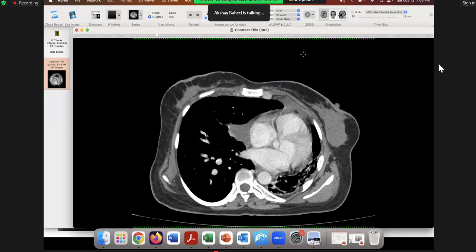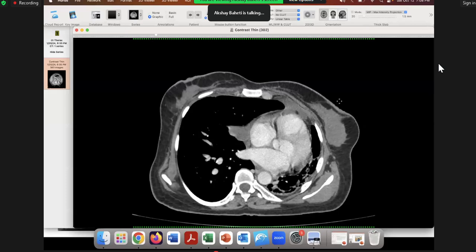So this one is a little tough. I mean, in the sense it's not, so every Tata person will catch it because we are so used to seeing breast cancers, and this nodal site, the hint is that it's a site of drainage of breast as well. Can you search for it now? Internal mammary nodes. Yeah, perfect. Right. So you can see, internal, right? So that's big, right?